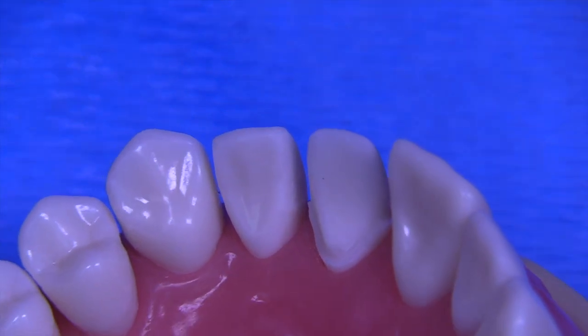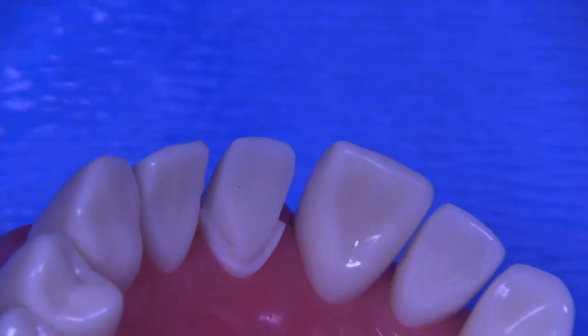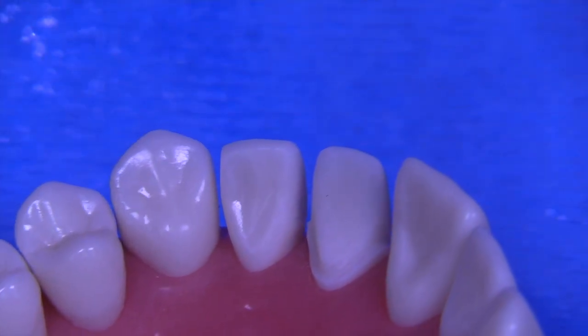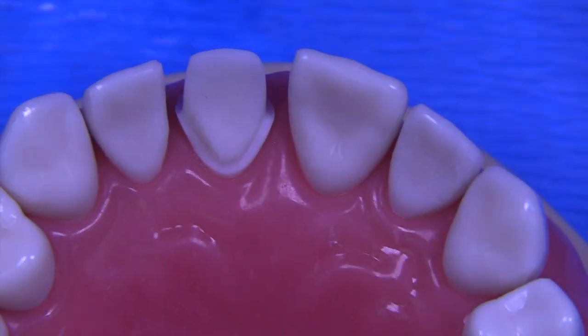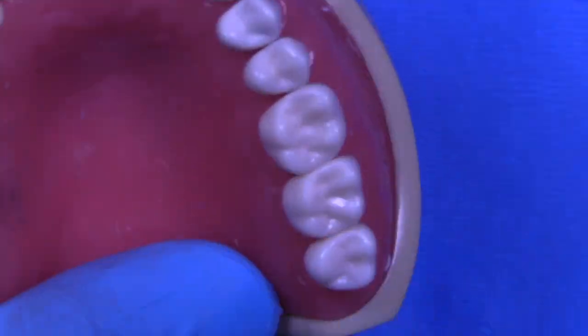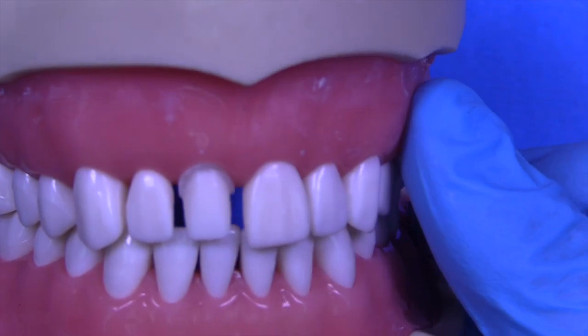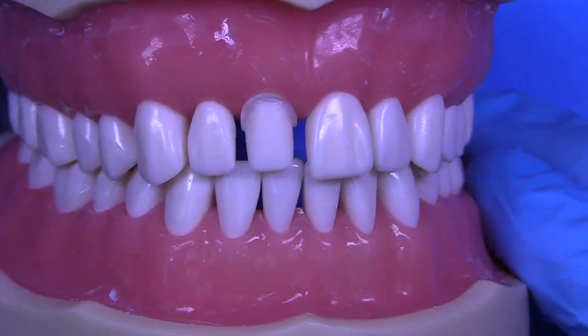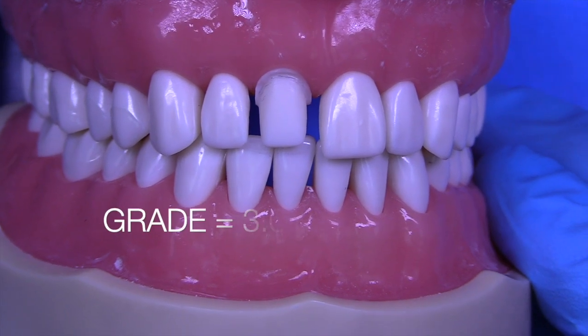And then we look at the mesial tooth and the distal tooth, and you can see that we have some scraping and we have some scuffing on both sides. So, you know, there is some damage. It's not a major amount of damage. I'd like to see zero damage, of course. But in terms of the preparation, there's enough going well for this that I think I would probably give it a 3 out of 5 overall.